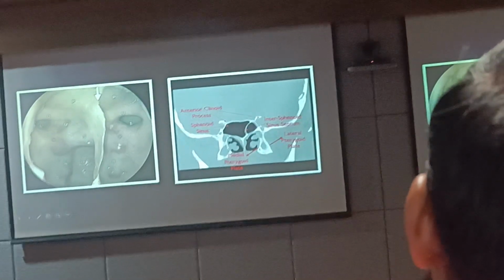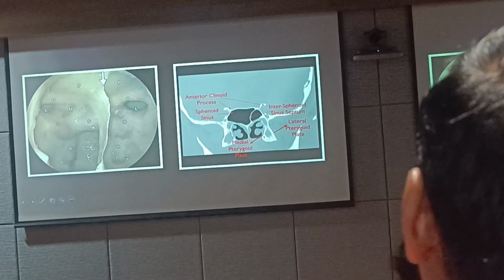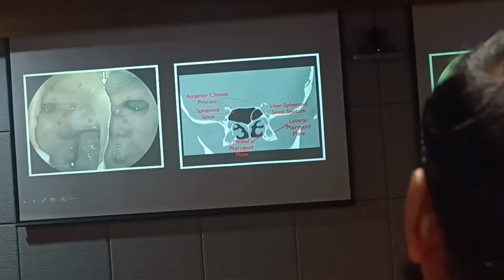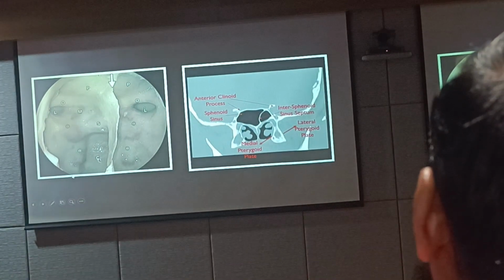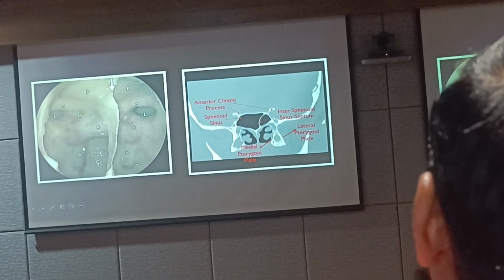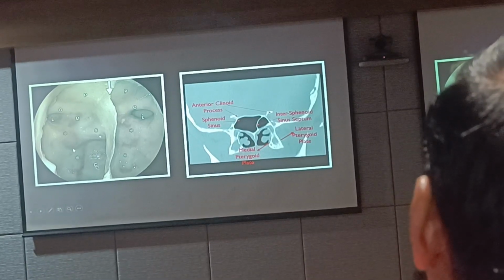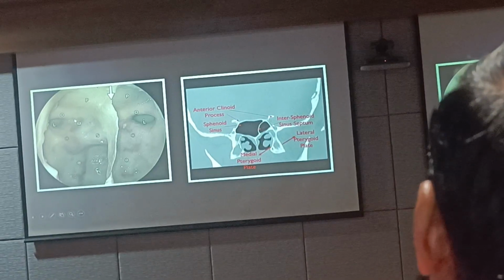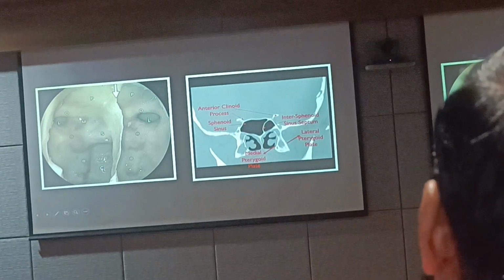Now, what is the orientation of the carotid over here? Okay, you can see this carotid bulge like a C-shaped thing, coming down here and then turning from here, right? So this is nothing but the paraclival segment of the carotid. This is the anterior genu bend. This is the posterior bend, and once it goes into this, it goes into the intracranial segment.